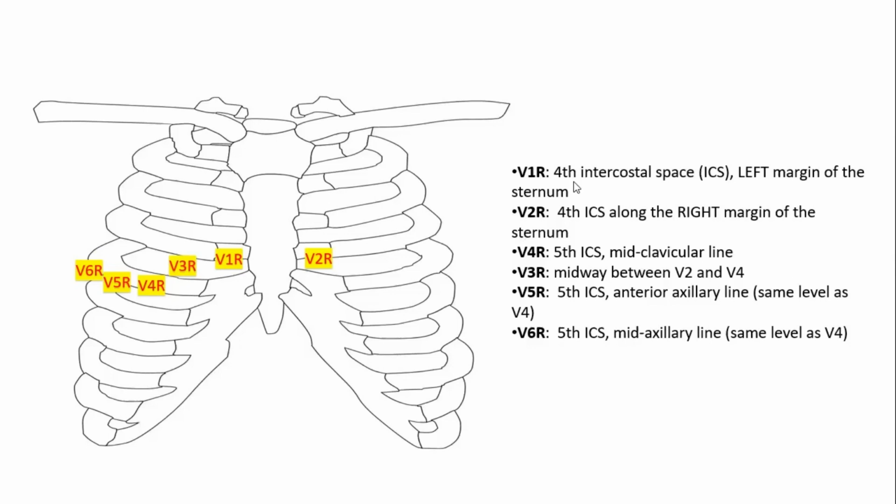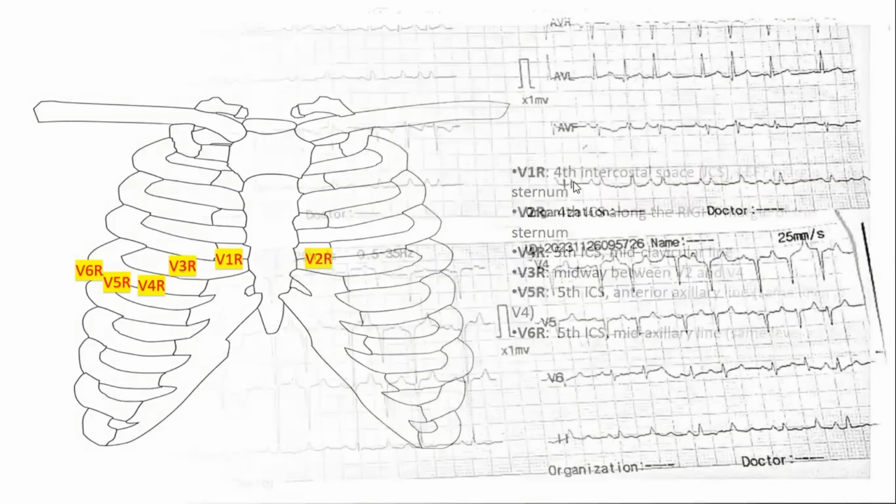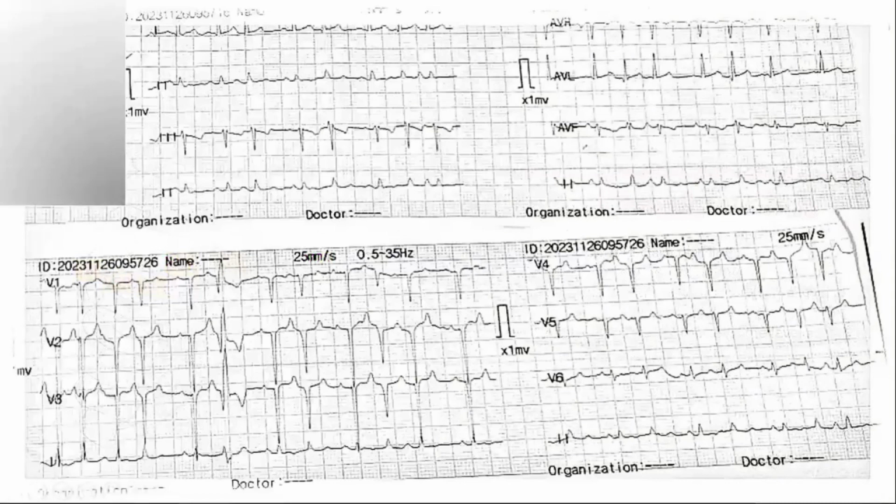Okay, let's move forward. Things will be getting a bit difficult now. I think this was just to warm you up. I've not given the history because history will not definitely help you a lot in the case of arrhythmias. You just have to use your clinical knowledge and expertise for that.